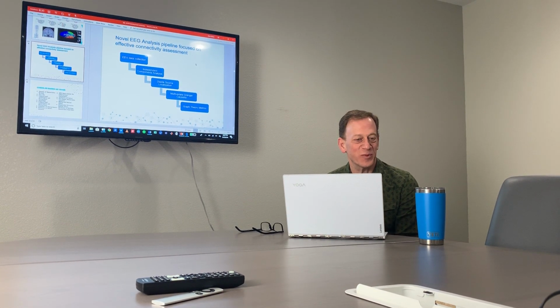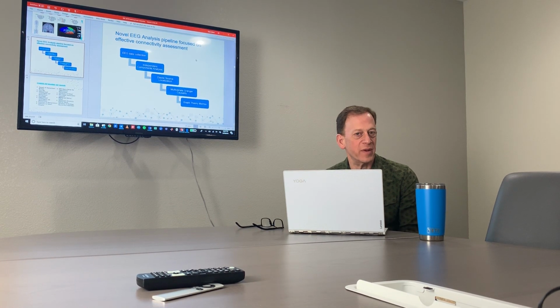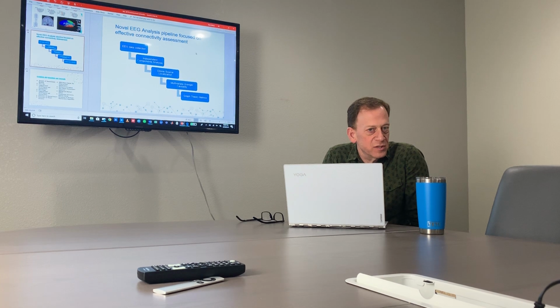Okay. Hi, everyone. Today we're just going to spend about 20-25 minutes talking about our EEG analysis process, going through a sample of what we now call brain functional analysis. Other people call it quantitative EEG or QEEG. And our techniques are somewhat unique, so we're just going to talk about the process we go through, and then we're going to go through an example of someone's BFA, or brain functional analysis, and what that means and what we think that means for that individual.